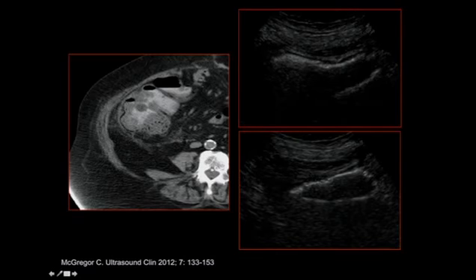So we thought, well, we'll bring this patient to ultrasound. And sure enough, on ultrasound, we were able to confirm the presence of pneumatosis. Now, pneumatosis is certainly not an ultrasound diagnosis, but in addition to this, we were unable to get any arterial flow in this loop of bowel. And so between these two studies, our suspicion of ischemia was increased, and this patient did go to the operating room for ischemic right-sided disease.